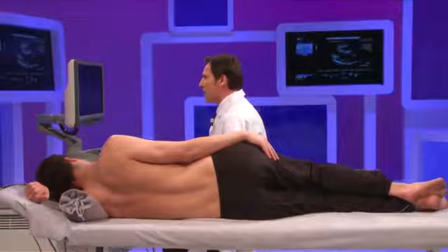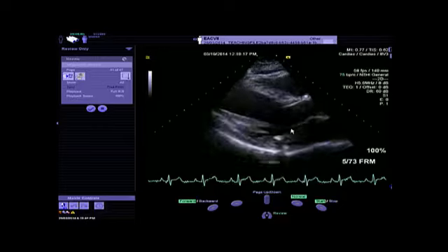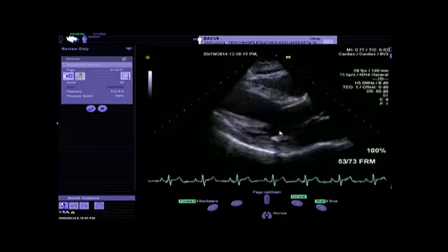But be careful. For the diagnosis of mitral valve prolapse, you should use the parasternal long axis view just related to the saddle shape of the mitral annulus. Don't try to use the apical four-chamber view to make the diagnosis, because you will have some false positives in this situation. So for sure, during the examination of the mitral valve morphology, you should also be able to determine the likelihood of mitral valve repair. And there are several criteria to be analyzed. So first, if there is some redundancy, if there are calcifications, and what scallops are involved in the disease process.